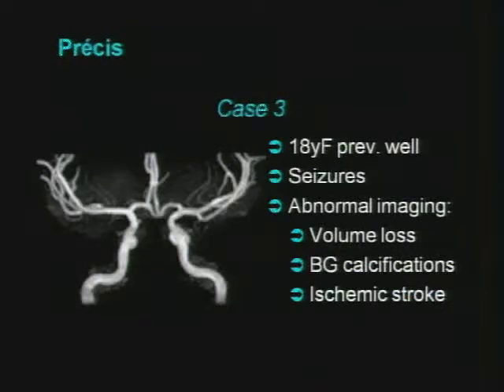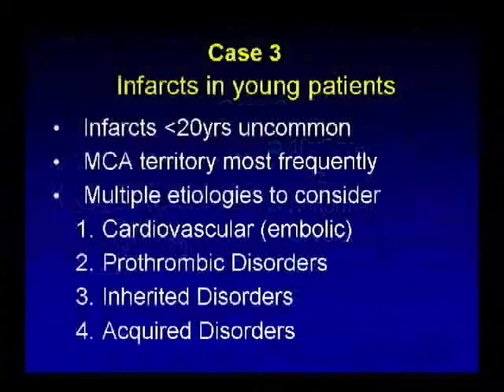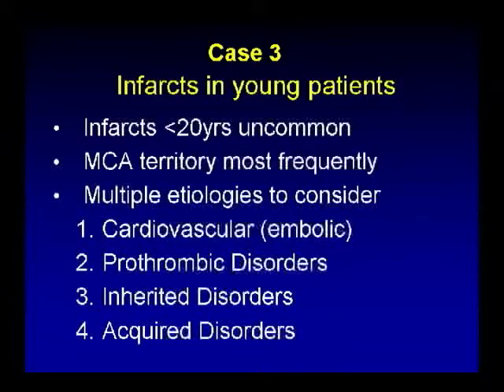So something bad is going on here, and we need to tie this all together. So the first thing I'd start with is the infarcts, because this is obviously a pretty bad thing. The other things are probably related. And if you see a young patient, you've really got to have a good list to work through. And these are the things that you should be thinking about and talking about with your clinician for an infarct in a young patient.